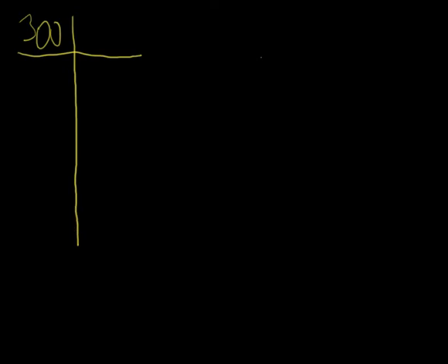So if I take this 300 large blocks that go by every minute, and there was a QRS, a heartbeat that occurred on each and every one of those. These beats were really crammed close together, because you've seen what the graph paper looks like now, and that would be a really fast heart rhythm. If 300 boxes went by per minute, and there was a beat on each one, well, quite logically then, we'd have a total of 300 beats per minute.